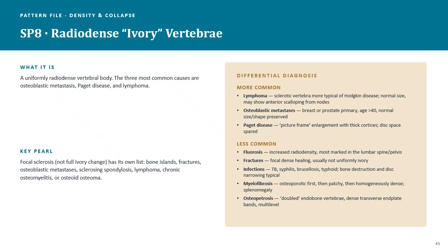When it's spreading throughout the bone, it's going to stimulate some sort of abnormal bone production for the patient. We see this sometimes with breast cancer and also our prostate cancer patients. Those are primary cancers, and they can produce this ivory vertebrae, or this dense appearance of a bone.